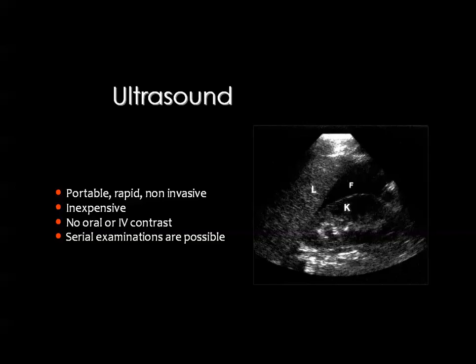And this is actually the main role of the ultrasound in emergency, to identify intraperitoneal fluid indicating the presence of hemorrhage. And the patients are usually unprepared for the ultrasound examination, and the bowel gas may disturb the ultrasound images, and so the main target of emergency ultrasound used in the casualty rooms or departments is to detect intraperitoneal fluid.